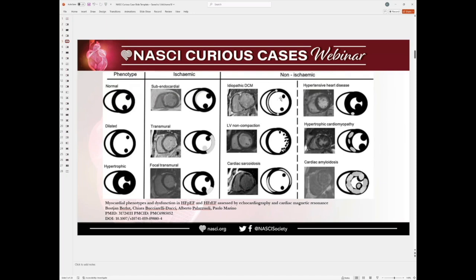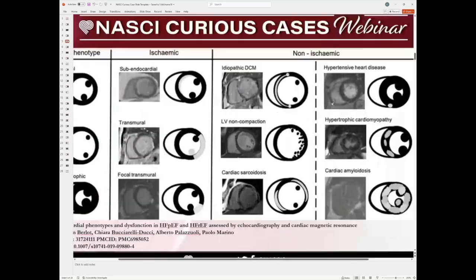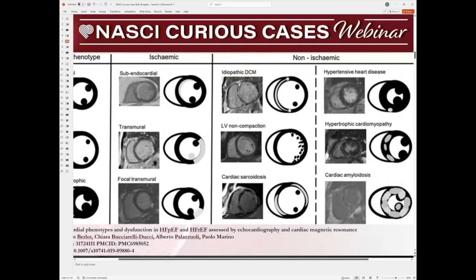In this dilated cardiomyopathy, if you look at it, it's not just delayed enhancement. The myocardium is thinned and dilated, and you may be able to see basal interventricular mid-myocardial enhancement. The other thing is you're looking at another heart here. As you can see, the myocardium is really thick. When you think about that, you have to combine all these findings to make the diagnosis for non-ischemic cardiomyopathies.